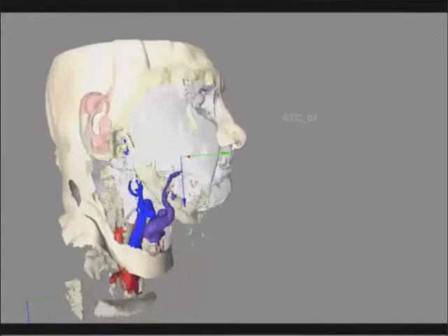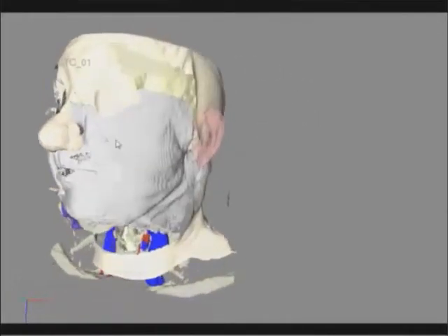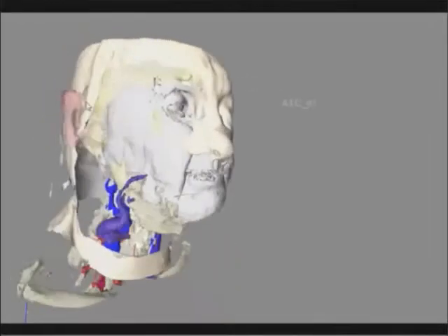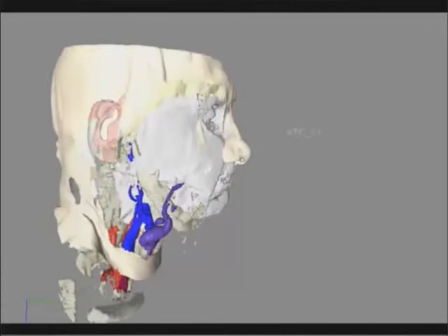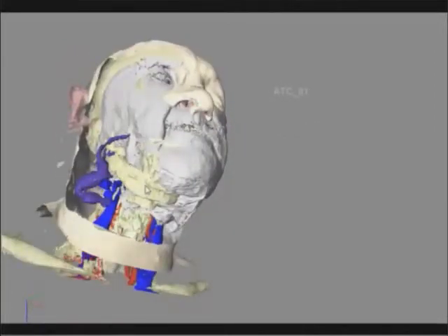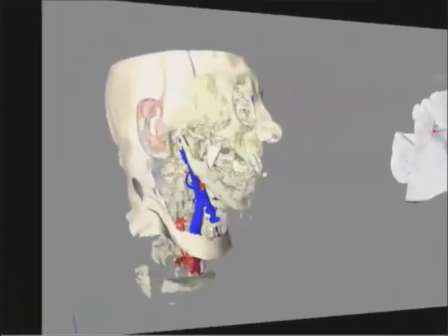If we apply the same dissection to different virtual donor heads, we can see that given the morphological alterations of the patient's facial and bone structure, not any donor is compatible. For example, this is simulation number 1, where some structures are not covered. Therefore, this potential donor is not compatible.